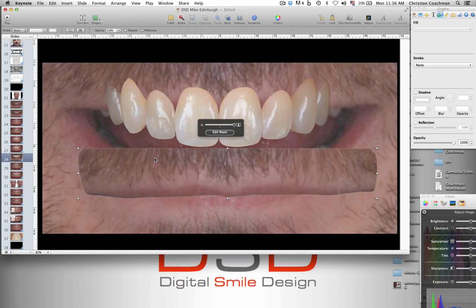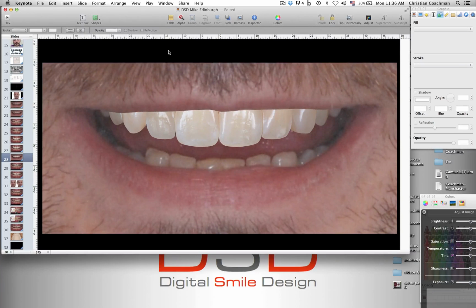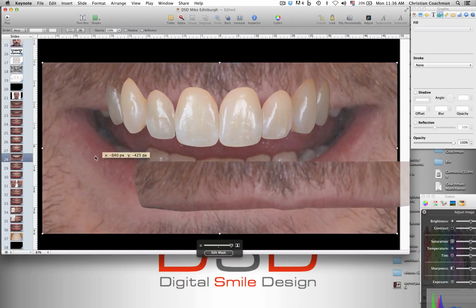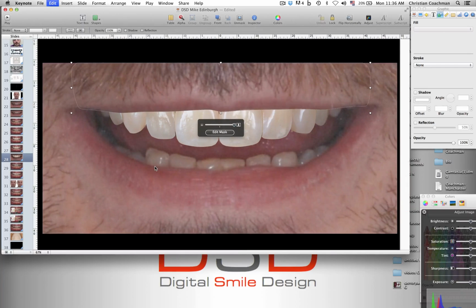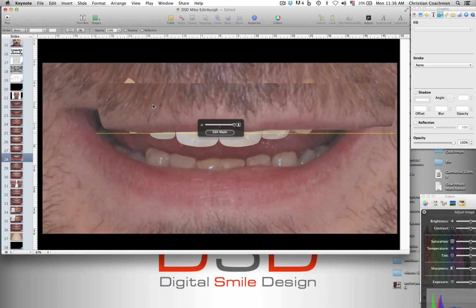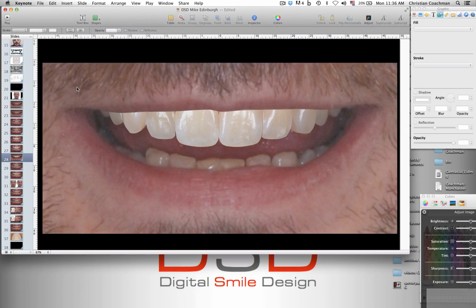That's what I can't quite get my head around. What is on top of what? So that's the bit you've cut. You have here the picture. Picture, teeth, lip, and the lip. Right. Okay. So because this lip is perfectly overlapped, you don't see there's two pictures.